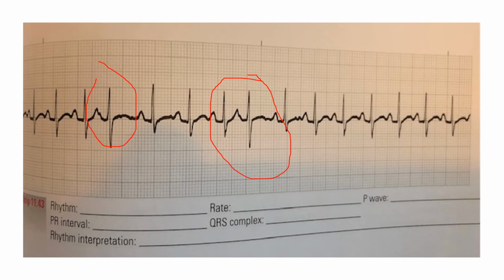If you look at the T waves of these two beats, they look different than what the other T waves look like. So there's more energy in these T waves, because the P wave is in there. So there is a P before that QRS, and therefore we will call that a PAC.